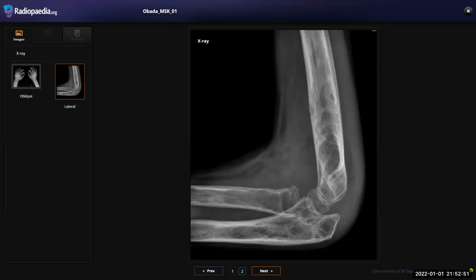I just want to focus on the soft tissue swellings. You gave a good differential, malignant transformation of the enchondroma, but with bilateral involvement and the soft tissue swelling, pain, and fever, I know this is a good differential. Another differential, can you give me for causes of soft tissue swelling, bone lytic lesion, and periosteal reaction?